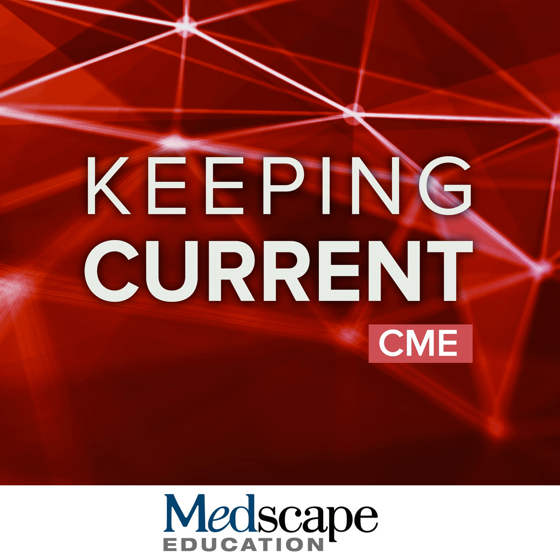Now, not all the time do standard cine images work, and this is particularly in the case of patients who cannot hold their breath or patients who have an arrhythmia. And if that occurs, you end up with a significant reduction in image quality, and you have to pivot at that point to real-time cine MRI, as shown here.